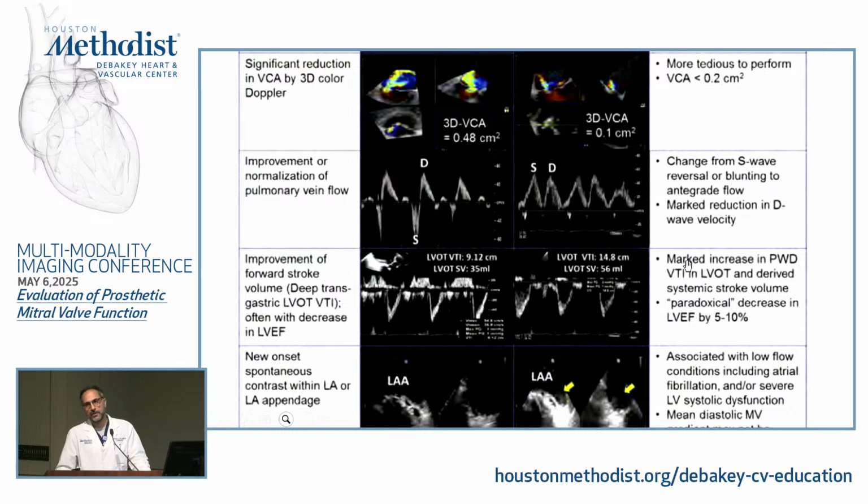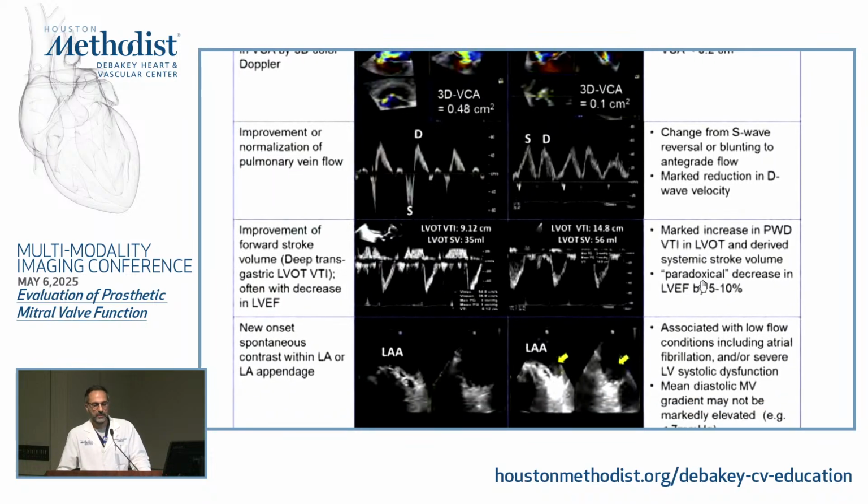You increase the afterload, right? Because you abolish the MR. So now the EF kind of shows its true reality in a way. And then you know that the MR is decreased.